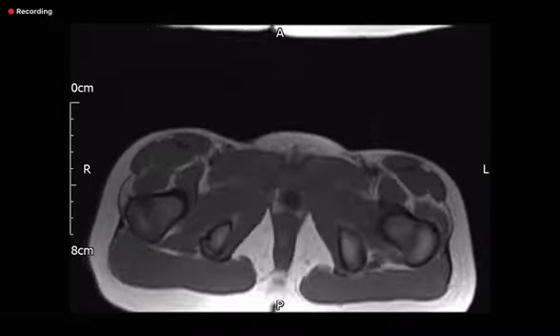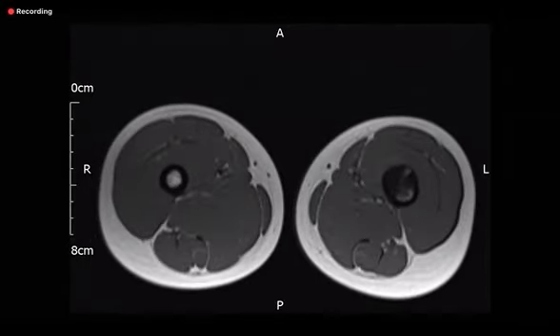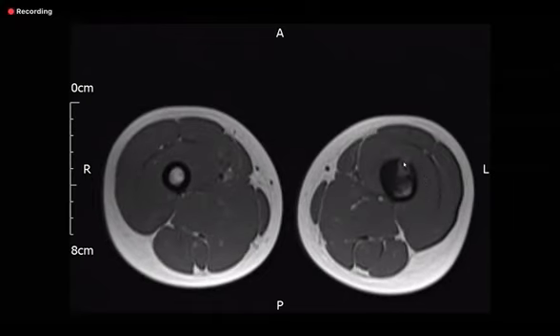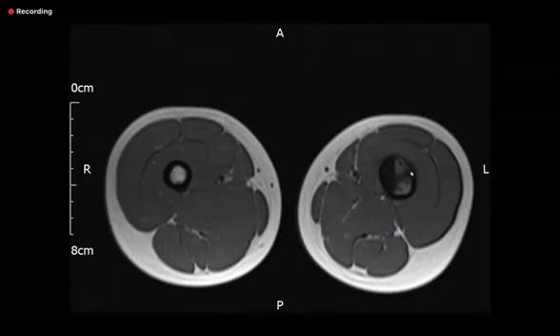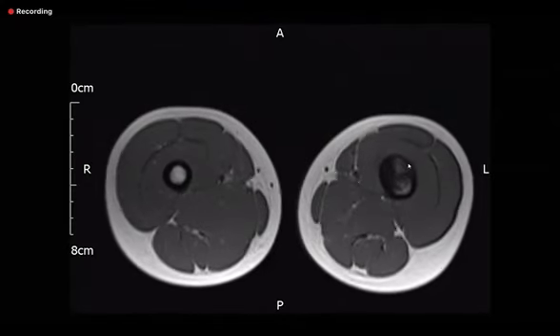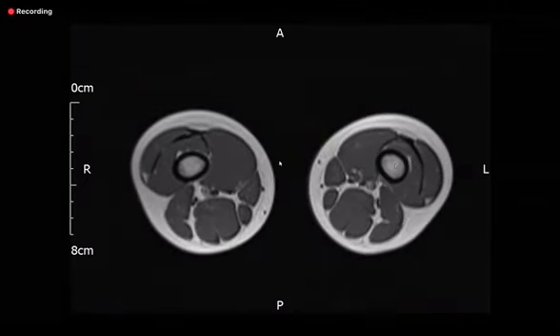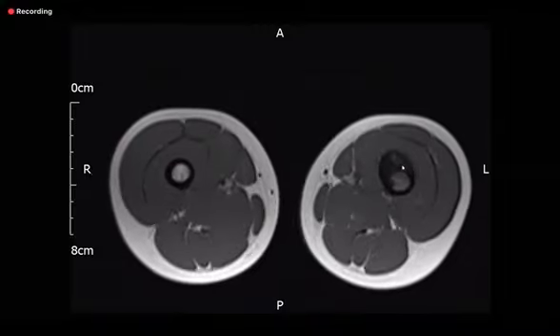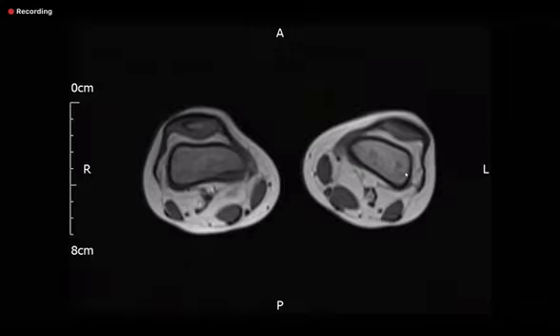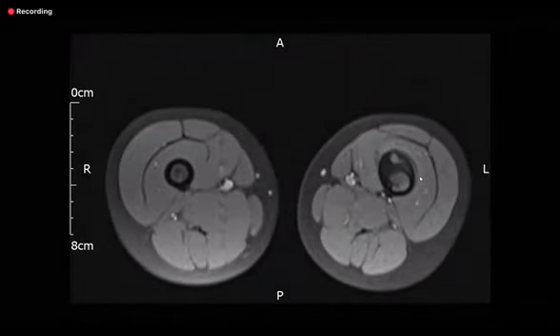Now, to make this diagnosis, this is a T1 weighted sequence. You can see that there is cortical thickening. And here comes that sequestrum, which is sitting inside this. And even here, you can see that breach, which you picked up on contrast. So the marrow here is normal, but at this point, it is, of course, encroached and abnormal. And the same finding, the sequestrum, is a key finding here.